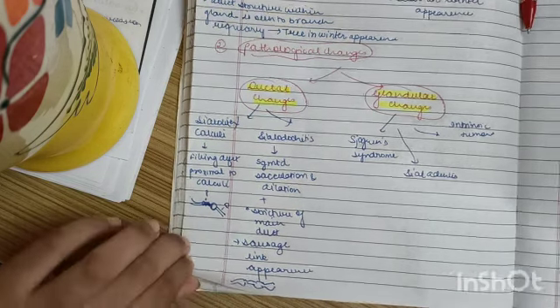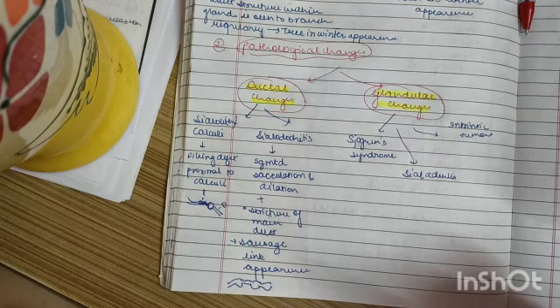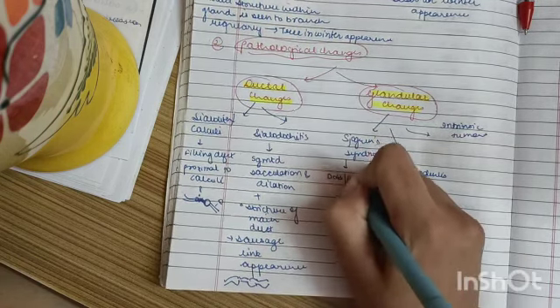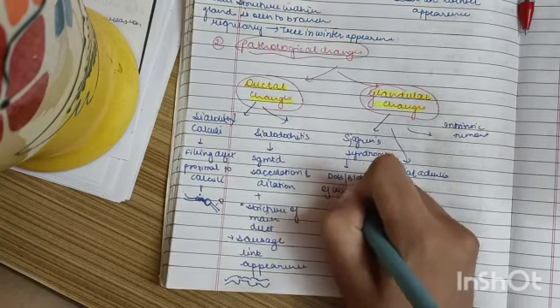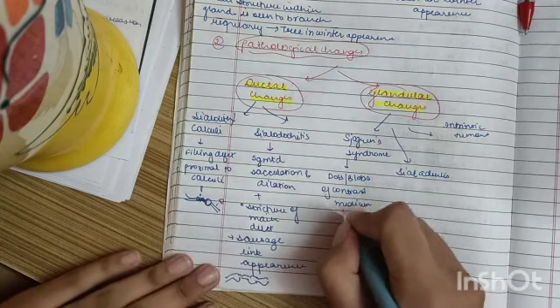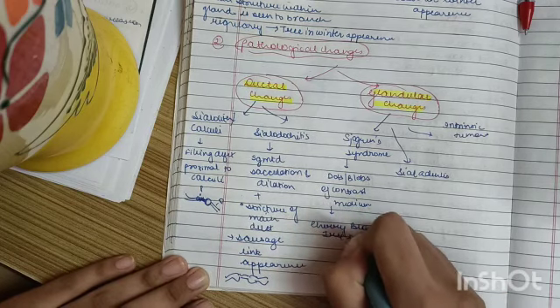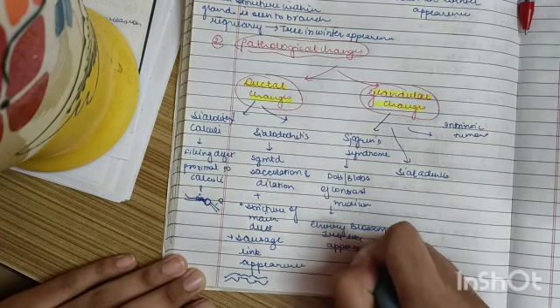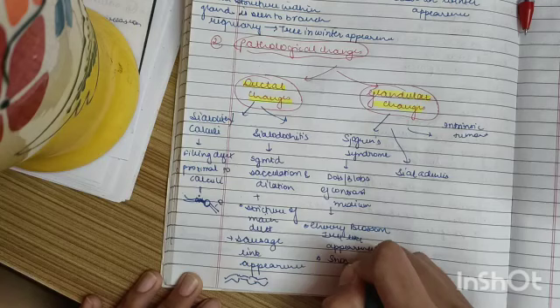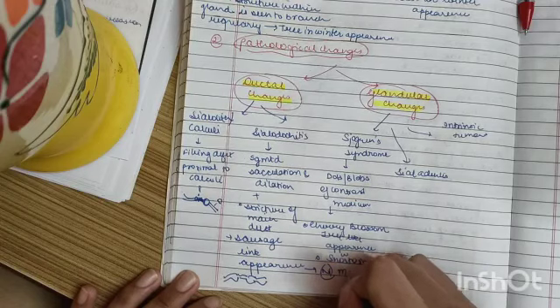Now Sjogren syndrome, very important. Usually we get a long note on Sjogren syndrome, a short note as well, so I'll also make a video on Sjogren syndrome soon and upload it. In this, you will see dots or blobs of contrast medium. It has a very characteristic cherry blossom tree-like appearance, or you can call it a snowstorm. The important point to remember is that it will have a normal main duct.